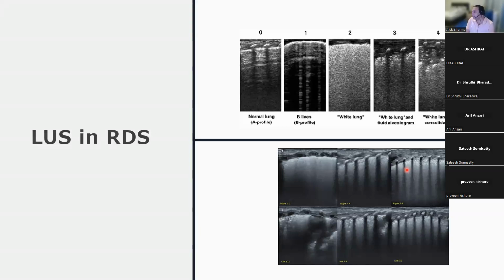And that's where I would say that there are challenges with how we use lung ultrasound scores, and that clinical correlation is very, very important. Because if this baby does not have significant work of breathing, the real question I'm asking myself is, why am I getting this ultrasound appearance? And again, I would go back to the quality of the images I'm getting. So just to go back to the present, any other questions?